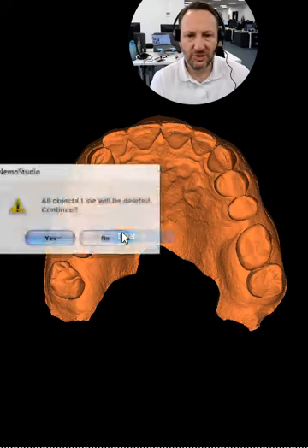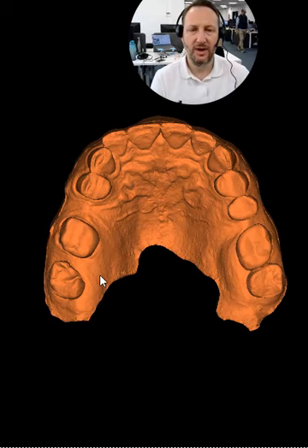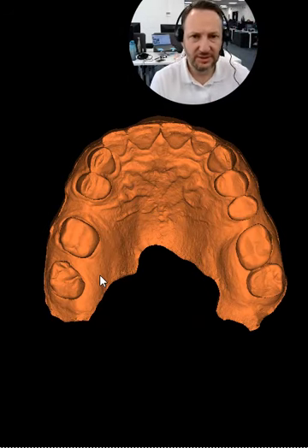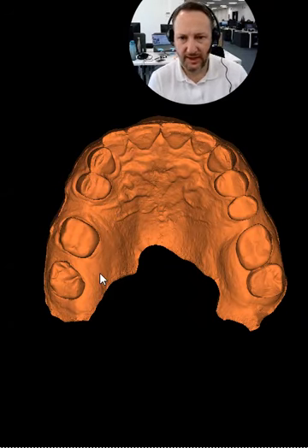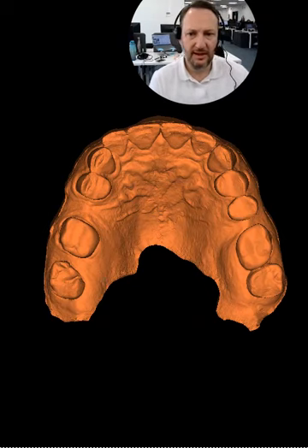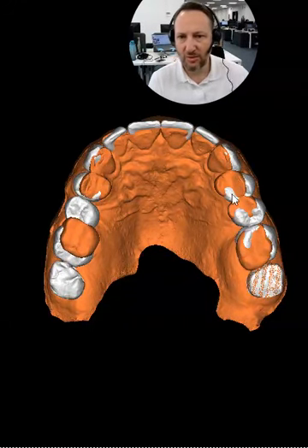But when we start evaluating the ideal design, when we start understanding where the midline of the patient is, where we need to place all these teeth, we start understanding the importance of the collaboration between implants and orthodontics. In this case, when we planned and did a setup and created a design that we can see here in white, we needed to change the midline a little bit. We need to distalize the second quadrant.